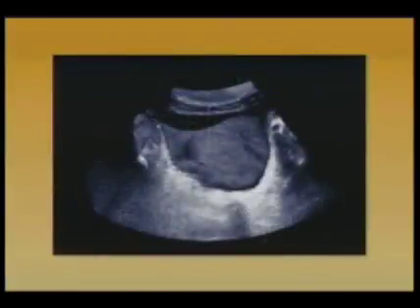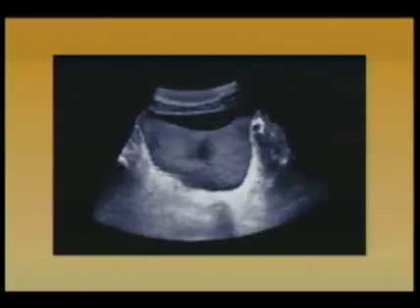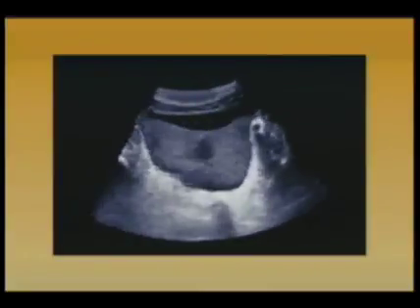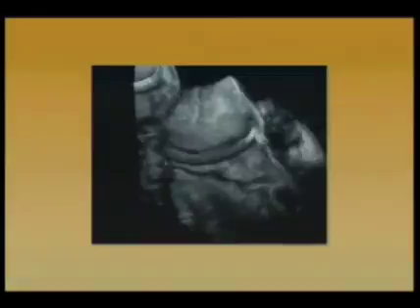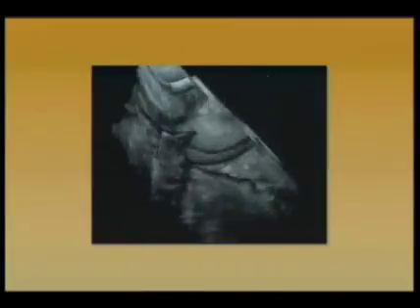Here's another example of the bladder. In fact, this is the same bladder I showed a few slides ago that's been reconstructed in 3D. And again, because it contains urine, which produces great contrast with the soft tissue of the bladder wall, we can see the contours of the bladder wall very clearly. And to further illustrate that point, here's a case of a bladder that is filled with urine, but is also surrounded by ascitic fluid. So not only can we see the inner contour of the bladder wall, we can see the outer contour as well.